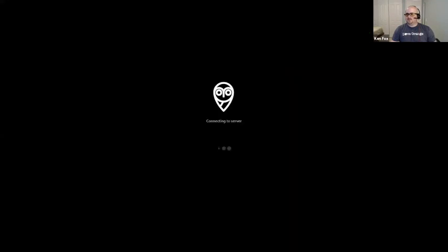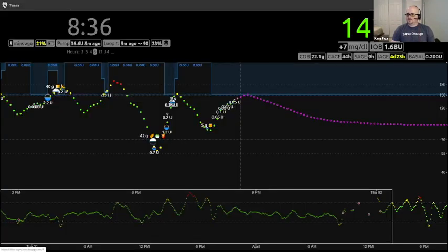That's not what I wanted to do. Don't hit the little noisy thing here. This lets you test the alarm.